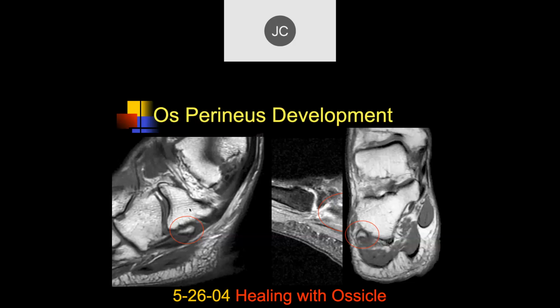I think these often occur in areas where you have partial tears of a tendon or a ligament. And in the healing process, in some people, they'll have an ossification process occurring, which goes on to a mature ossicle within the tendon. So since the bulk of these occur in very characteristic locations, they tend to occur in locations where there is a high risk of injury to those structures. I think a large number of these ossicles within tendons and ligaments are actually post-traumatic and acquired. And also, we don't see them often in kids.